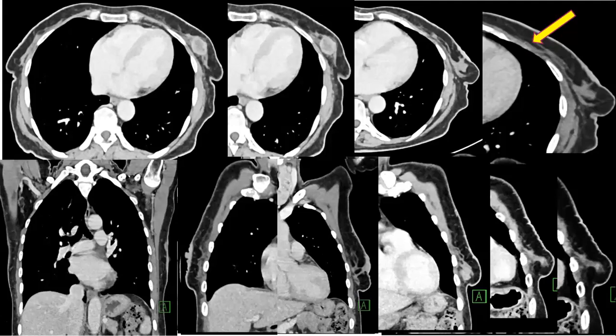And if you go down, you can see posteriorly here, look at the two sides. Look at the skin on the left side, definitely thickened compared to the right one. And if you go on, there is a lesion posteriorly. You see, this is a lesion, and look at the ducts going from the lesion to the nipple area. And here you can see the mass and the involvement of the chest wall.